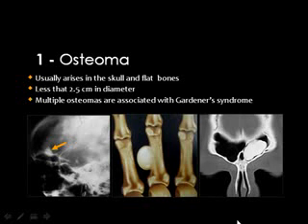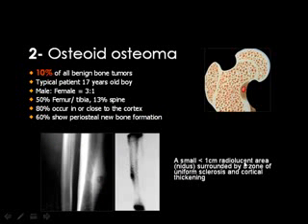We start with the osteoma, which is the ivory osteoma, or the osteoma which does not contain a medullary cavity. There is no cancellous bone in this osteoma, and it is an easy diagnosis. It is commonly present in the paranasal sinuses, like this osteoma in the frontal sinus and this one also in the frontal sinus. This is an easy diagnosis, the ivory osteoma.